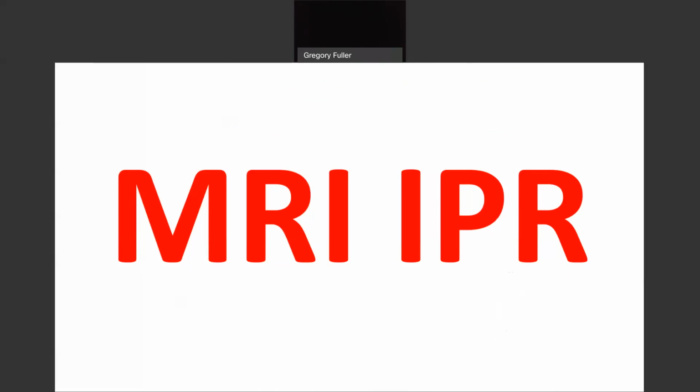MRI, instant pattern recognition. All right, you ready for this? We're still warming up. I want someone, just feel free again, use the chat function, or you don't have to, but it helps me to be able to make comments. This is an instant pathologic recognition.